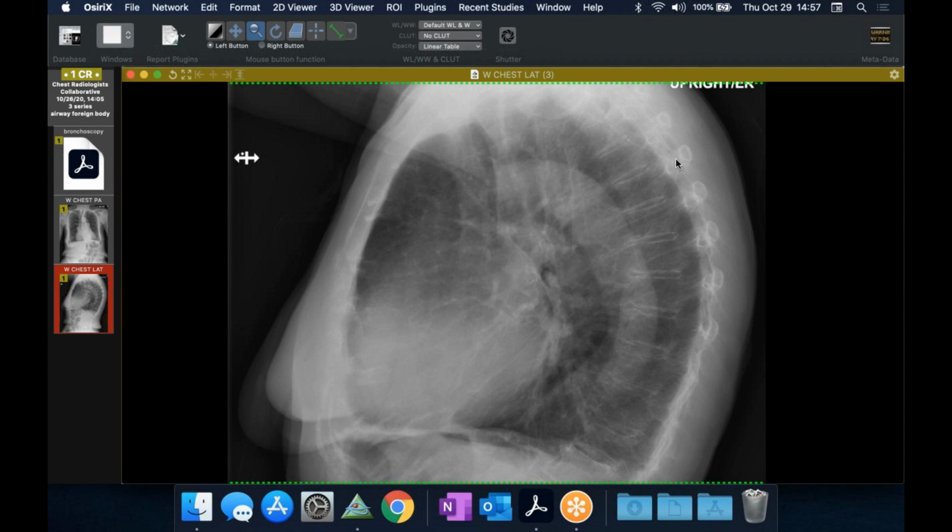But a good radiograph, where if you have a high index of suspicion and you're looking for it, it's probably easier to find this. But that's one of the areas. And we had that nice carcinoid case, I think last week or the week before, where in retrospect you wondered if you could see the tip of the iceberg on a radiograph. But that's always a tough area. On the lateral, it's important to look at the air column and try to explain this. It's so smooth, unless it's a vessel, you have to explain that. And that was the tablet there.